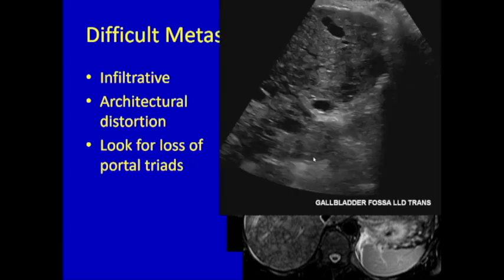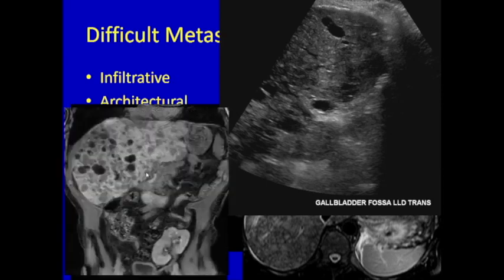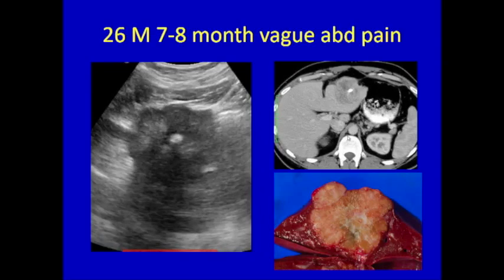Here's another one. This patient had polycystic liver and kidney disease, transplant patient. See the lesions? Really hard because the cysts give you some through transmission. Give you another image. Start looking back here. Again, there should be portal triads here. They're not here. Here is the MR, here are the cysts, and again, innumerable lesions. This was a metastatic Merkel cell carcinoma, just an enormous number of mets interspersed, and these cysts made it very difficult.